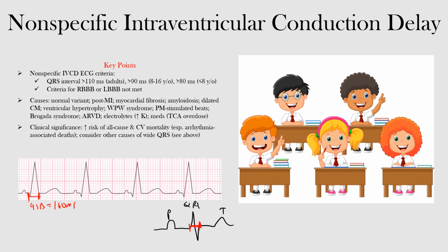Now, clinically speaking, while this may seem like a small detail to look for, studies have indicated that patients with this nonspecific intraventricular conduction delay are at greater risk of all-cause mortality and cardiovascular death, especially arrhythmia-associated deaths. So while it may seem trivial, make sure to look out for it and consider the other causes that we mentioned above for wide QRS complexes.